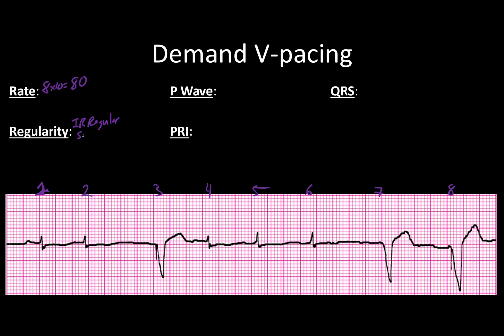Some pacing. No ectopy. And I'll talk about beat number 7 and why that's not an ectopic beat. And we've got 1 spike per QRS. And you may not think that's true because of beat number 7, but again, I'll explain that in just a bit.